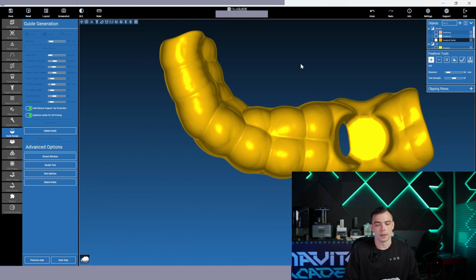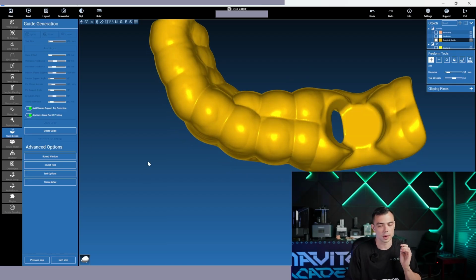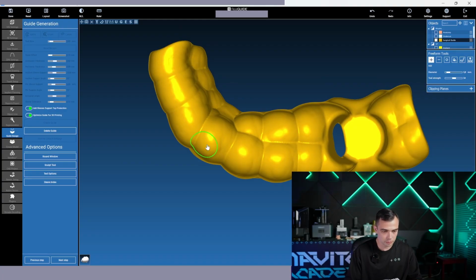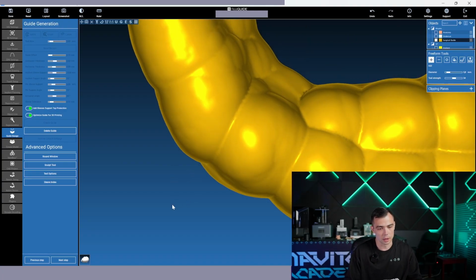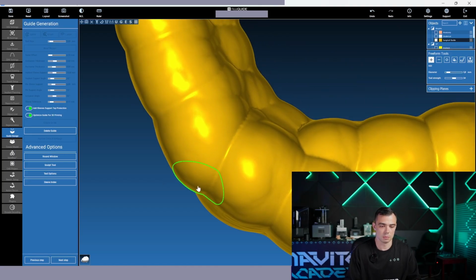And the third thing: since we have a teeth supported guide, always put control windows. They are installed in various ways, but I will just show you how we do it. We have to find the area between two teeth. For example, here I see the most probable area between two teeth, and I press round window.